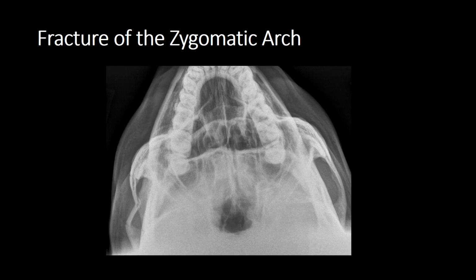It is adequate. Well, the patient is tilted to the right, but not rotated, and this SMV beautifully throws off the zygomatic arches. So they're clearly thrown away from the rest of the face. So this is a lovely picture.